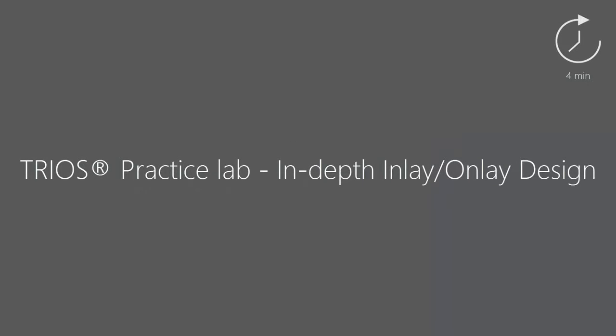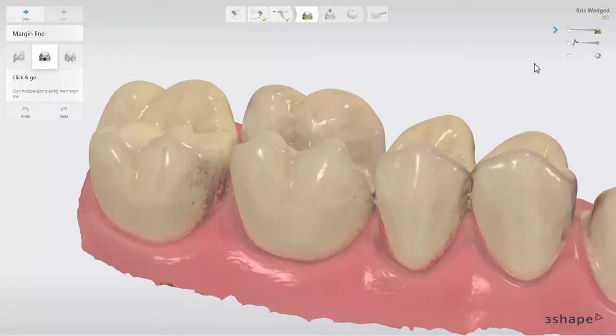In this video, you will learn how to design inlays, onlays using the Practice Lab Anatomy module. Once in the crown modelling module, which is dedicated to design restoration, you will start with setting the margin line. First, set the margin line for the molar.